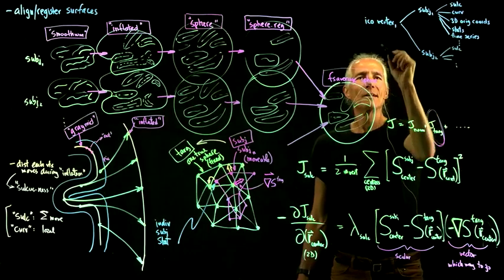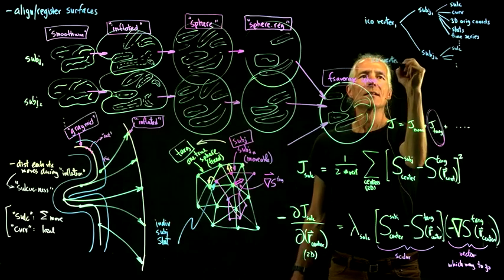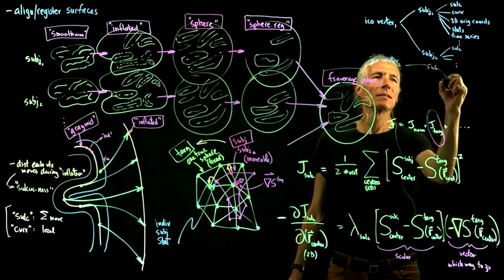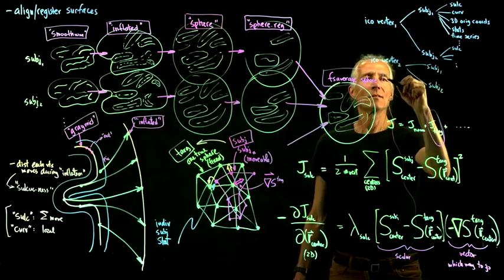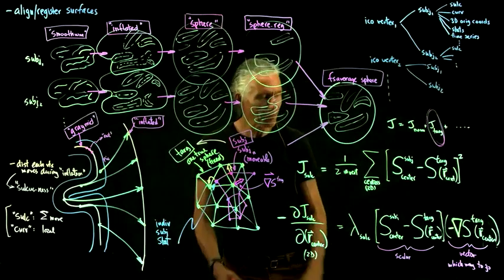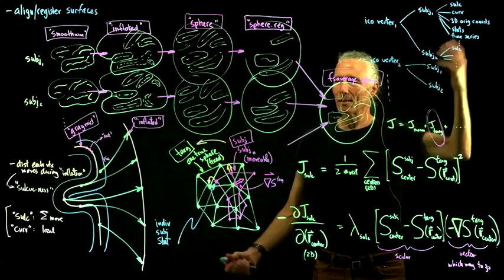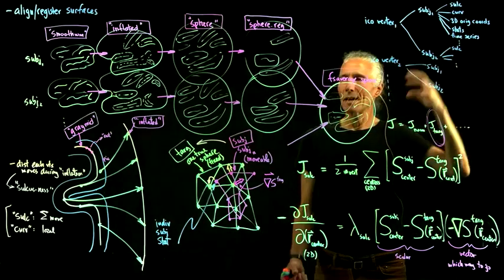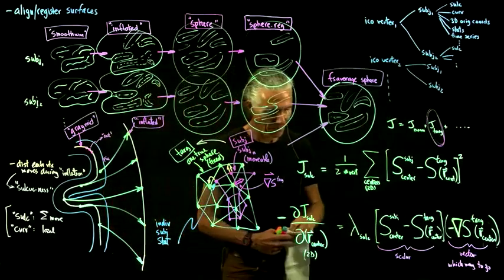And then we'll have the next ico vertex. So it's all in this somewhat strange list structure. And so you'll have subject 1, subject 2, all across those 160,000 vertices. So basically that will allow you then to do regular kind of stats you would do across subjects once you've got everything lined up into this system. So.